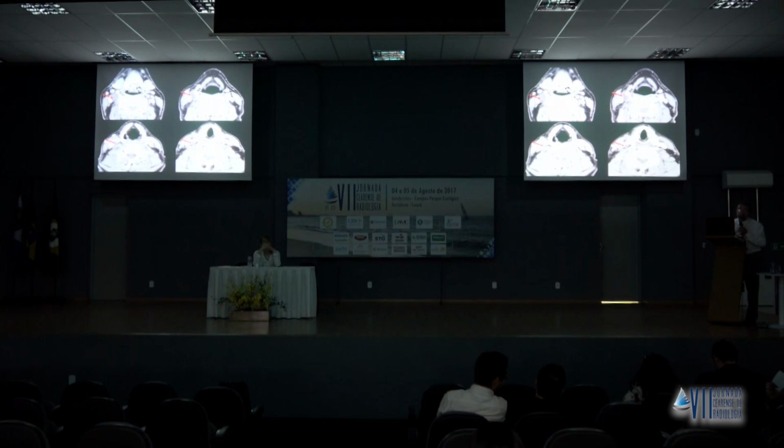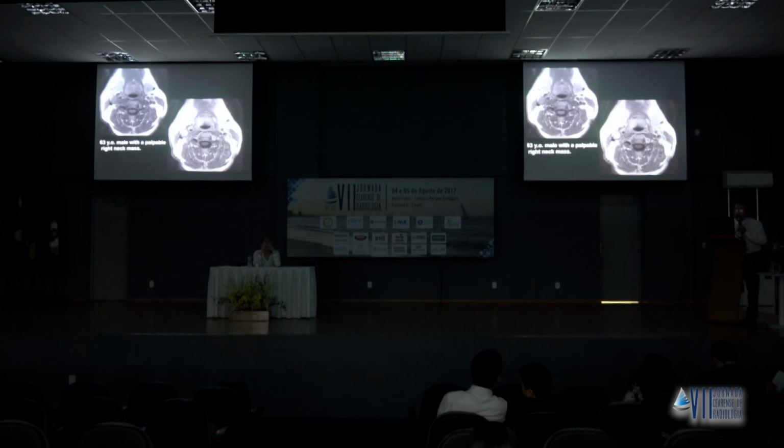And this patient went to surgery and ended up with vocal cord paralysis because during resection they had problems dissecting the nerve. In fact, a schwannoma is easier to dissect because it grows at the periphery of the nerve, not like the neurofibroma that goes inside the nerve. So usually it's very easy to just peel this off. On the MRI, you can see pre-contrast and post-contrast. Behind the artery, you see this bullseye appearance, which is very typical for neurofibromas, neurogenic tumors.